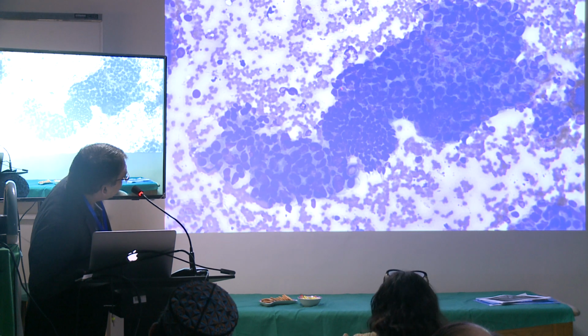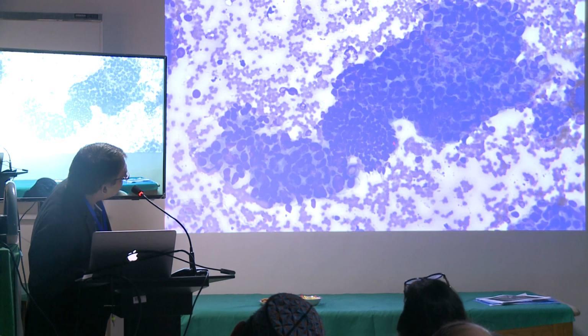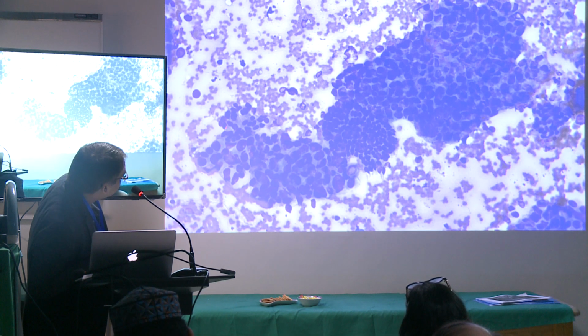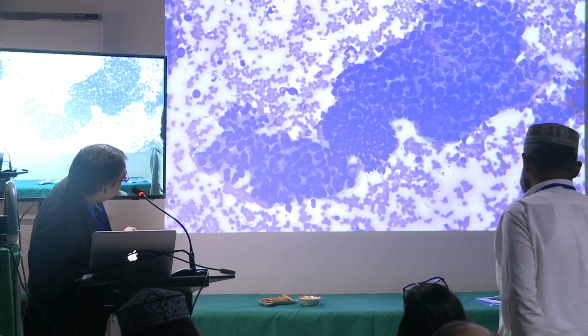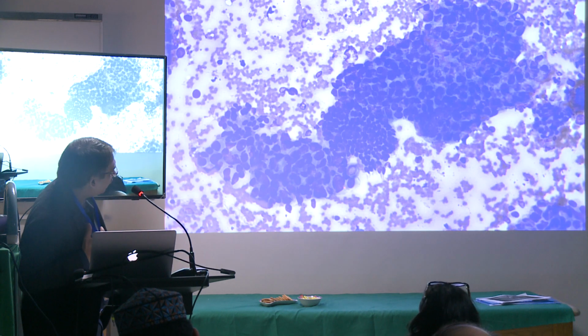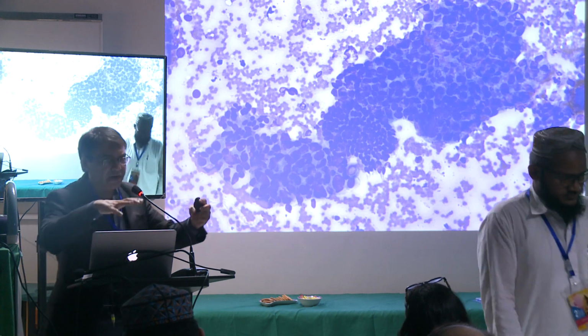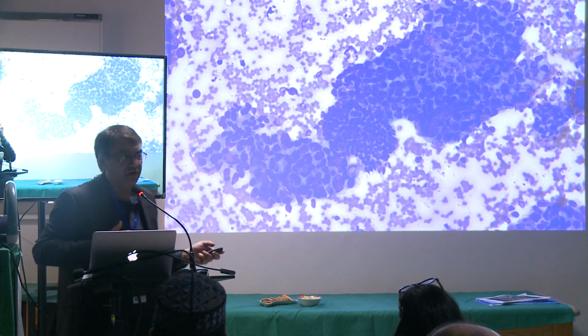If you look at the cells, these are really different sizes of cells. These are different sizes of cells, right? So when you take a look at the nucleus and compare the size with the RBCs, it's pretty much 4 to 5 times more. You can easily fit 5 RBCs in that nucleus. So that's quite a large size of the nucleus.